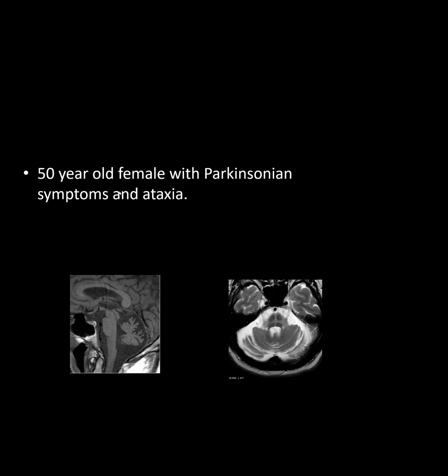So this is a person with a Parkinson plus syndrome. If you look at their brainstem, on the sagittal T1 and on the axial T2, what do you see? First of all, on the sagittal you see significant atrophy of the cerebellum, and then on the axial you see the hot cross bun sign on the brainstem. So I think that's MSA.